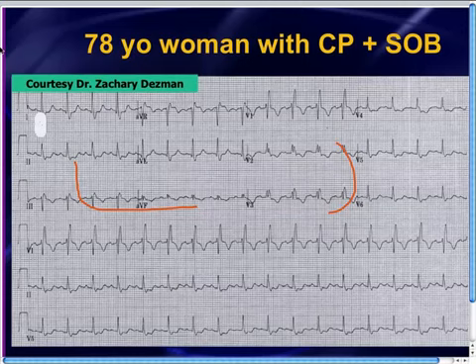So just 3 more cases to build on top of the video cast that we did back in December 2011, which talked about T wave inversions in PE. Here are another 3 more cases demonstrating this is not an uncommon finding. Large PEs will produce T wave inversions that mimic inferior and anteroseptal ischemia. So, simple bottom line.